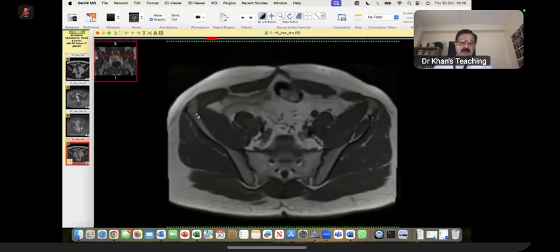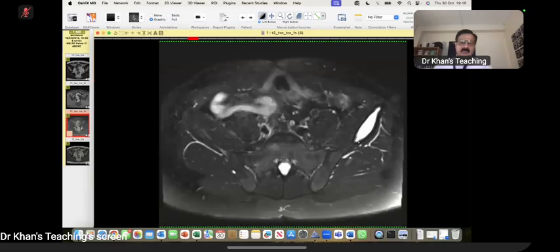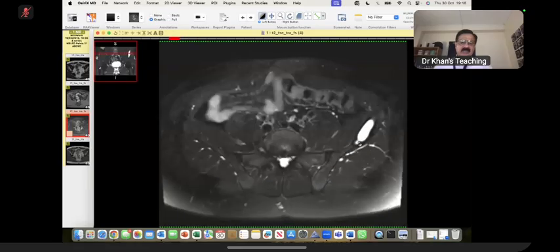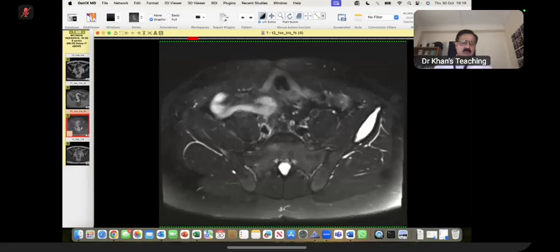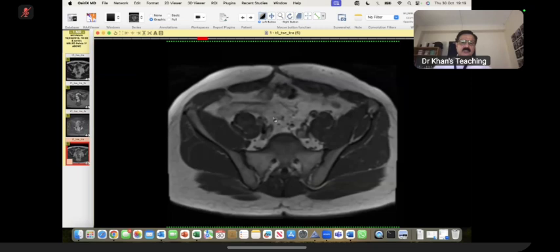this is the MR. On MR, please remember that bone tumors, for characterization, most of them are still characterized on plain film. Of course, MR has got a role, but here you can see a cystic lesion, if your baseline knowledge is that fibrous dysplasia can also be cystic.